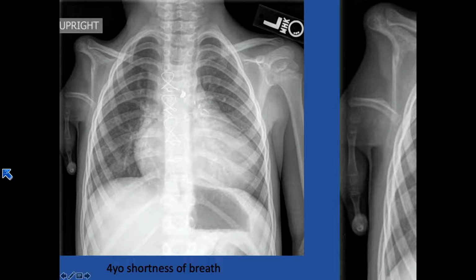If we look more carefully at everything, we see that, in fact, there's a very abnormal arm. The whole humerus is at least turned and partially missing. The scapula is abnormal, and most of even the lower arm is missing. And so this helps us diagnostically because it suggests that the underlying cardiac lesion is part of something called Holt-Oram syndrome. This child had both an ASD and tetralogy of Fallot, as well as absence of some of the musculature and this abnormally formed arm.